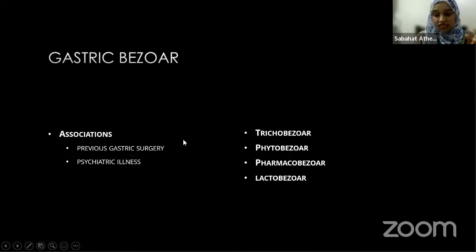And as discussed here, you have trichobezoar, you have phytobezoar, pharmacobezoar, lactobezoar. Tricho is hair, phyto is food, pharmaco is medicine, lacto is milk. Somebody asked me how to differentiate phyto or tricho. Honestly speaking, tricho usually goes till the duodenum and the stomach, but I don't have a 100% answer to that, I apologize. This patient had BPD surgery 8 years back. Okay.